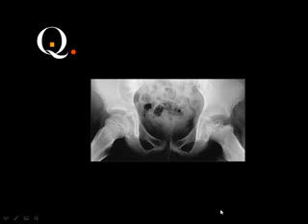It is not slipped, but whenever you see the epiphyseal line, don't ask about the age. And in examinations, they usually consider this as a big mistake, because the major difference between the ages lies in the fusion of the epiphysis. Before fusion, certain diseases; after fusion, other diseases. Then this epiphysis is affected in this particular area, and the metaphysis is okay. Then you are dealing with Perthes disease, and you see it in the frog position or the lateral view.